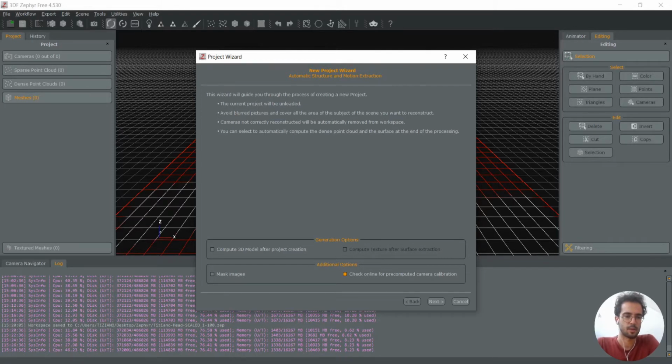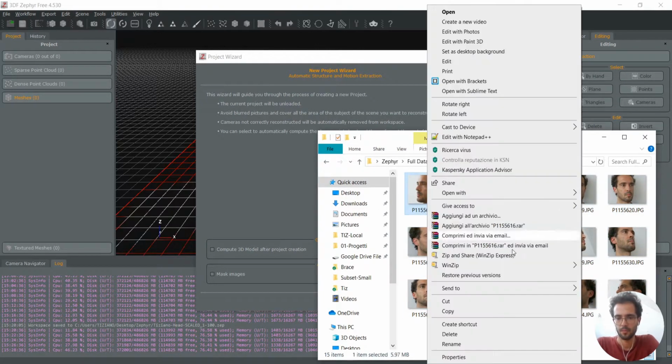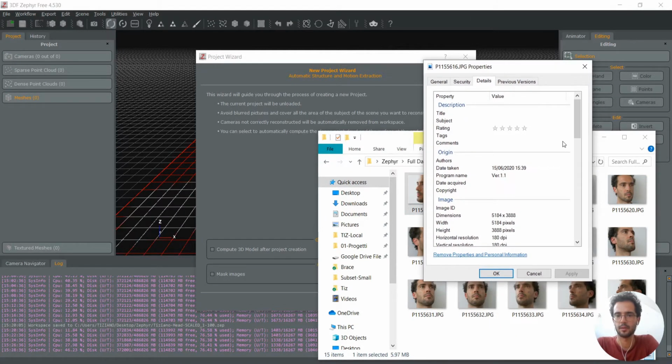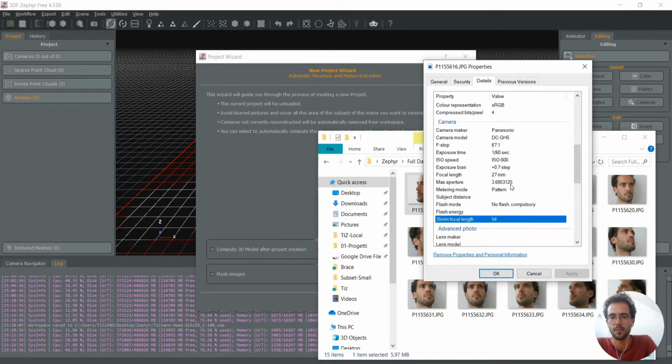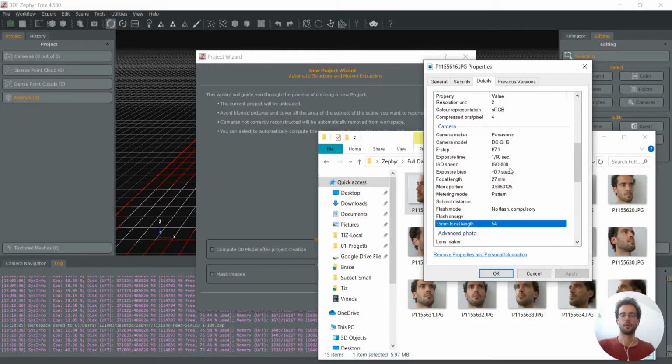That means that our photos need to have, inside the properties, if you go to details, you can see actually with which camera the photo was taken, what was the ISO setting, focal length, whatever. And this is used to look for distortion data on the web. This happens also with the other software we have talked about.